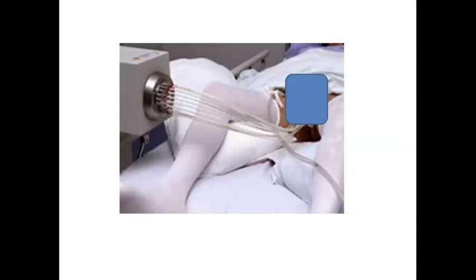About 2 weeks after the brachytherapy is done is when people get their external beam radiotherapy treatment. So the vast majority of patients having high dose rate brachytherapy are having it in combination with external beam. So in other words, it's given as a boost to try and increase the dose to the prostate where the vast majority of the tumour is and the key components of the cancer are. But they also need the safety margin of treating around the outside of the prostate, and possibly sometimes treating the pelvic lymph nodes as well, which is what happens with the external beam radiotherapy.